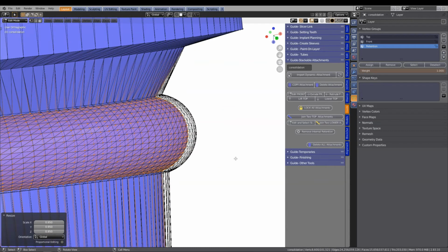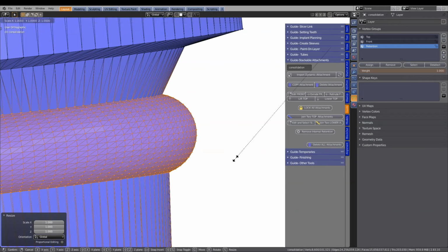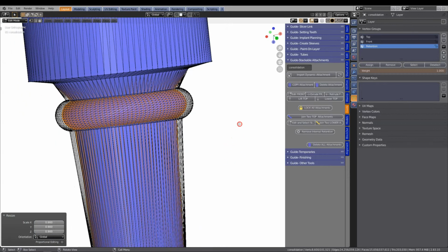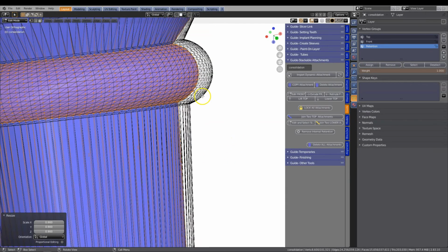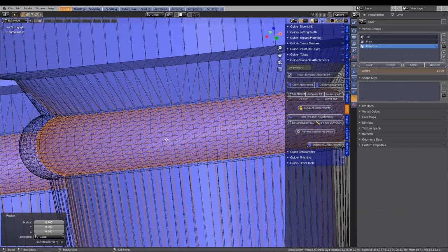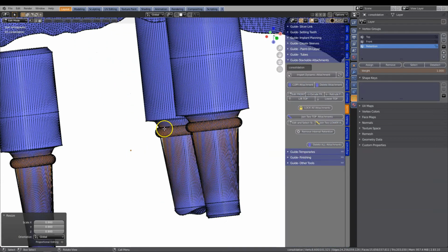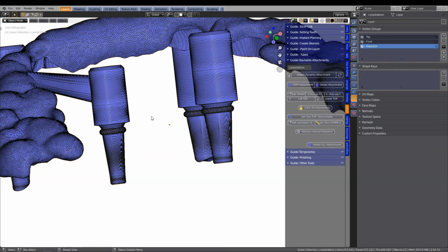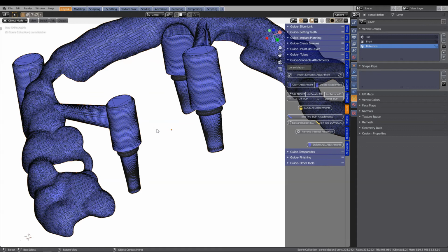I'm not 100% sure. And then we're going to scale S 0.90. Alright, so this has scaled it even more. So we've got even less of a clipping effect. And this would have done this across the board on each and every single one. So yeah, and then just tab out of edit mode, and then you can use it as it is with less retention.